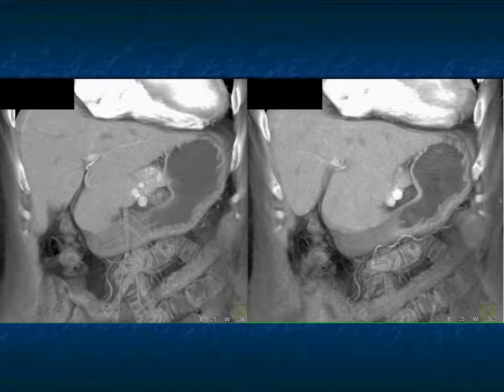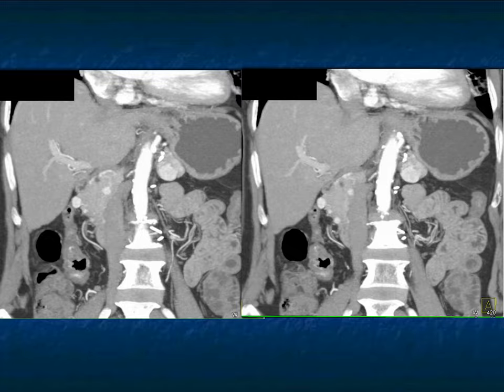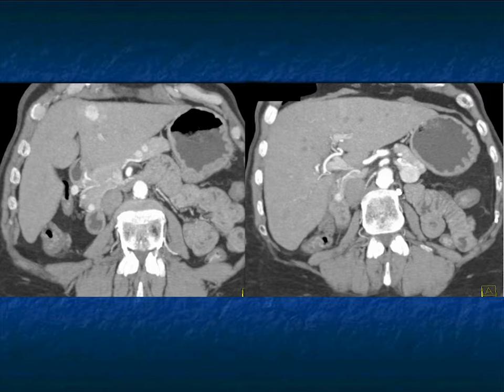There's some new chemotherapies, there's immunotherapy with chemotherapy. Patients with multiple sites of disease obviously are typically not going to benefit from additional surgery. You need to have other therapies at hand. And you can see very nicely in this example the patient's extent of disease. What else? Same patient, duodenum and liver and pancreas.